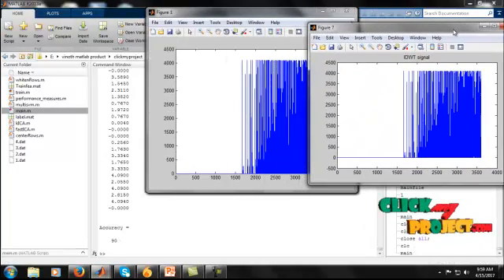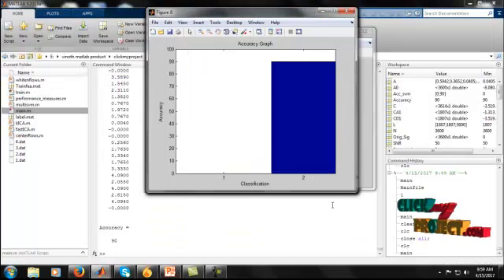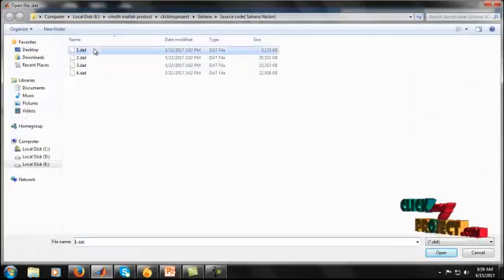So it is our input signal, and it is the signal after applying our inverse discrete wavelet transform. According to that signal, how much accuracy will we get? Approximately we get 90% accuracy for our input signal. Then we have to check another signal also.